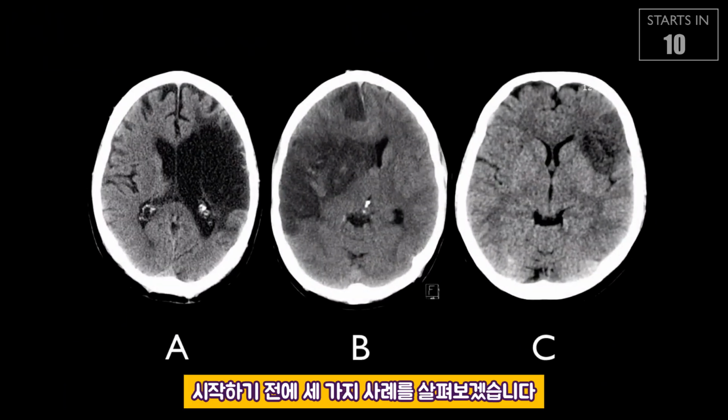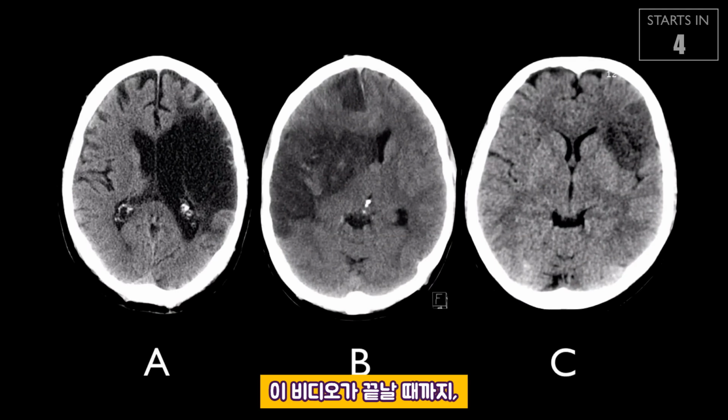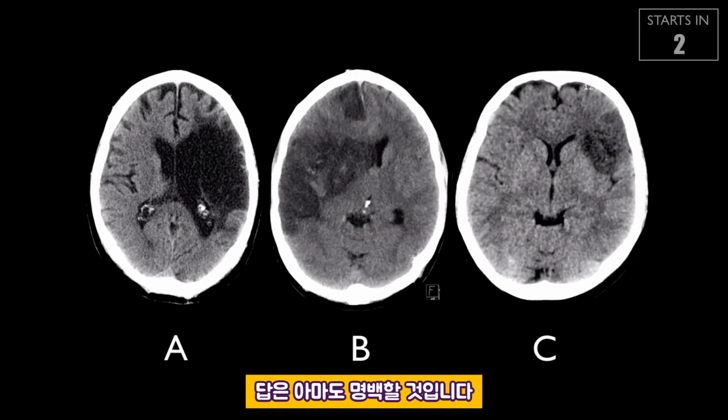Before we start, let's have a look at three cases. Which of these do you think demonstrates the features of a chronic infarct? By the end of this video, the answer should hopefully be obvious.